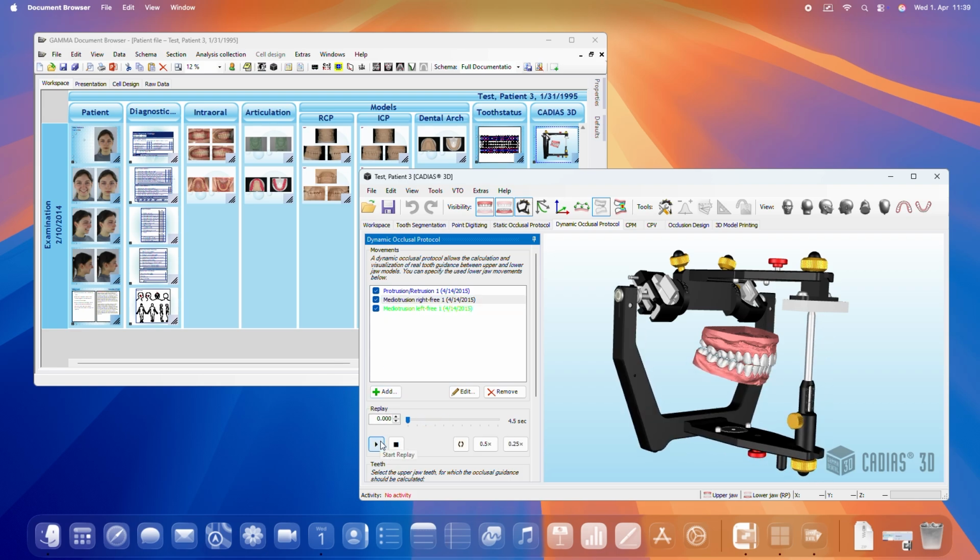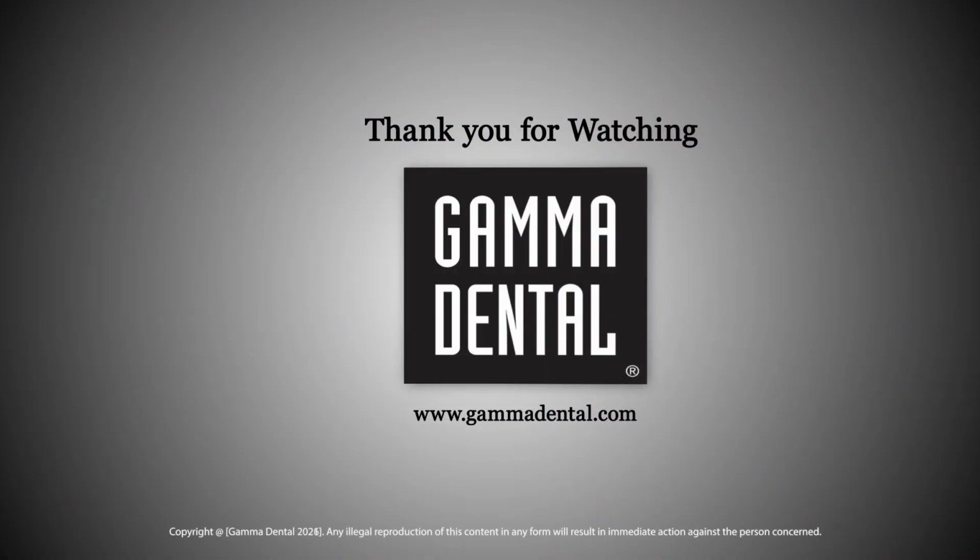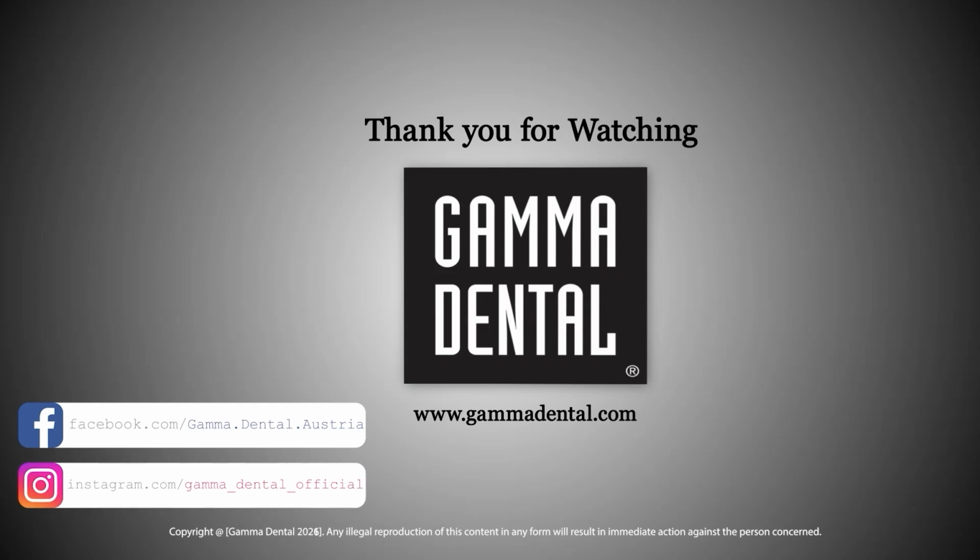These were the highlights of the new Gamma Dental software version 8.9.1. For all updates and detailed changes, check out the GDSW update information on our website and linked in the video description.